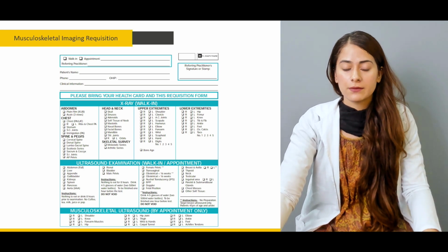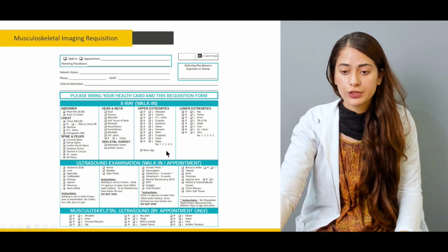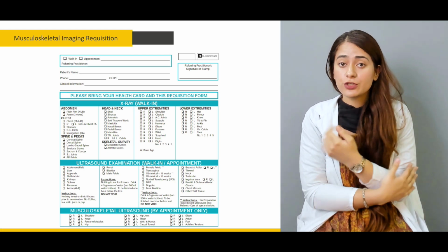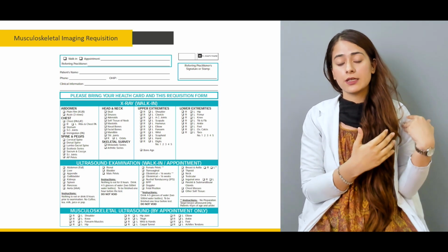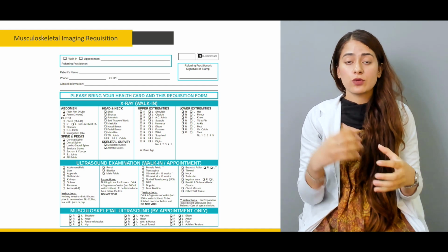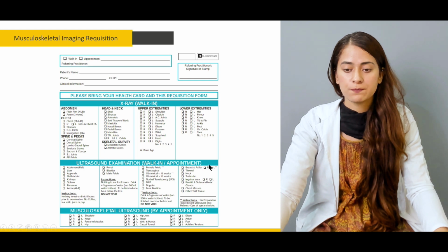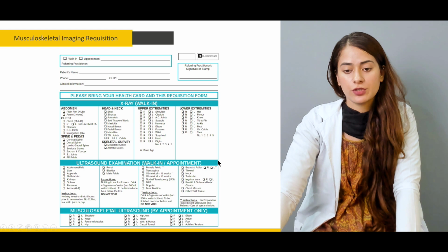in the entire body. So for the upper extremity, all the joints, from the joints in the hands, the bigger joints, the glenoid and the humeral joint, that is the shoulder joint, the radius, ulna, all the joints, all the bones, the shafts, the epiphysis, all are viewed, and this is the form, depending on what segment, body part, or structure is to be viewed.